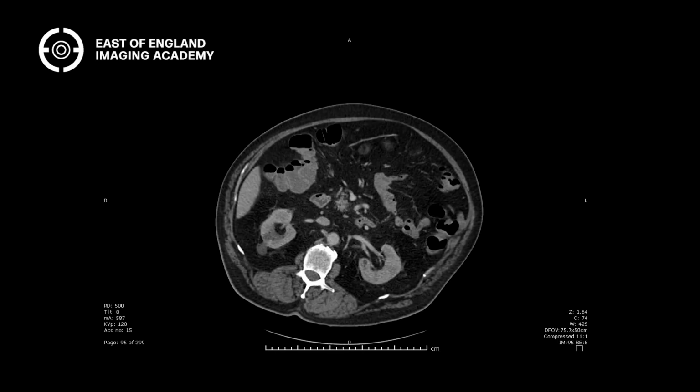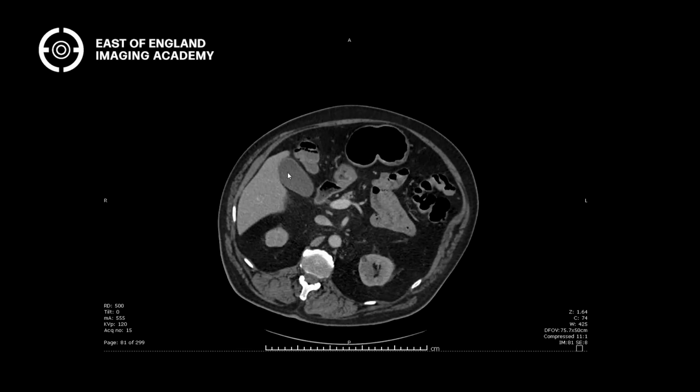And then you've got various fluids. Let's measure that. That's fluid in the gallbladder. Pure water is about 0 Hounsfield units; that's how the machines are calibrated. But fluids in the body contain electrolytes and proteins and things like that, so they tend to be a little bit more dense. So we say generally between 0 and 20 Hounsfield units is fluid.